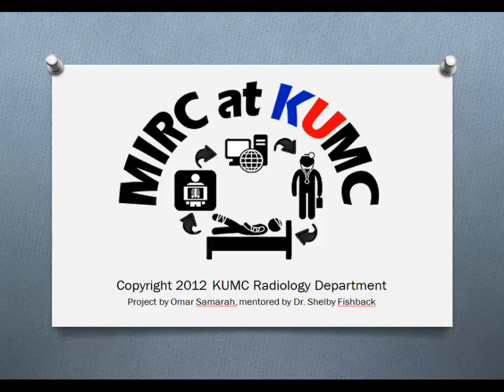Welcome to the tutorial on getting images into MIRC. A teaching file is, at its simplest, an image with some accompanying text. It's important to understand the ways in which images can be sent to MIRC so that you can create your teaching files using whatever system works best for you.